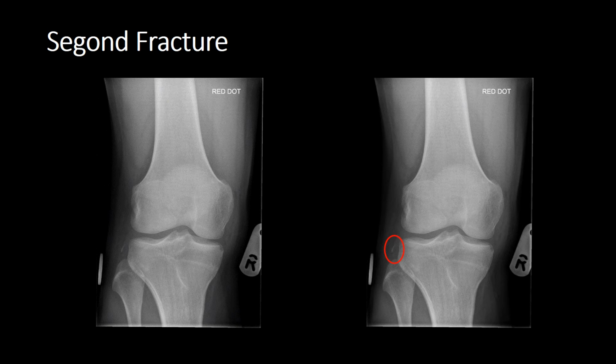You need to make sure that you don't confuse it with a tiny avulsion fracture of the styloid process of the fibular head, which is usually caused by the biceps femoris rupture. And also you can get another avulsion in this region of what's called Gerdy's tubercle. Now, Gerdy's tubercle avulsion injuries are a much larger osseous fragment, and you can see the host bone location because it's located more anteriorly. Gerdy's tubercle is not a significant injury, and it's an avulsion at the iliotibial band insertion.